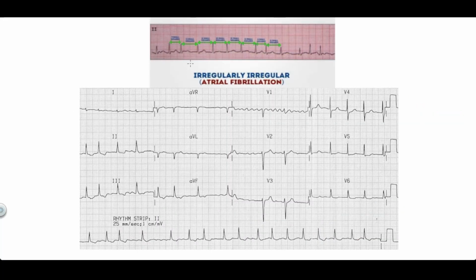So another important feature in ECG, you can easily see the rhythm of the heart. If you look at this closely, this lead 2, the RR interval varies. So opposite to what the example we have seen before. There the RR interval is similar in sinus brady and tachy. Here the RR interval varies. If you look closely, there is one large box, and here is 2, and here is 1, 2, and 2.5. So here is 1, 1.5. So this is a clear example of atrial fibrillation.